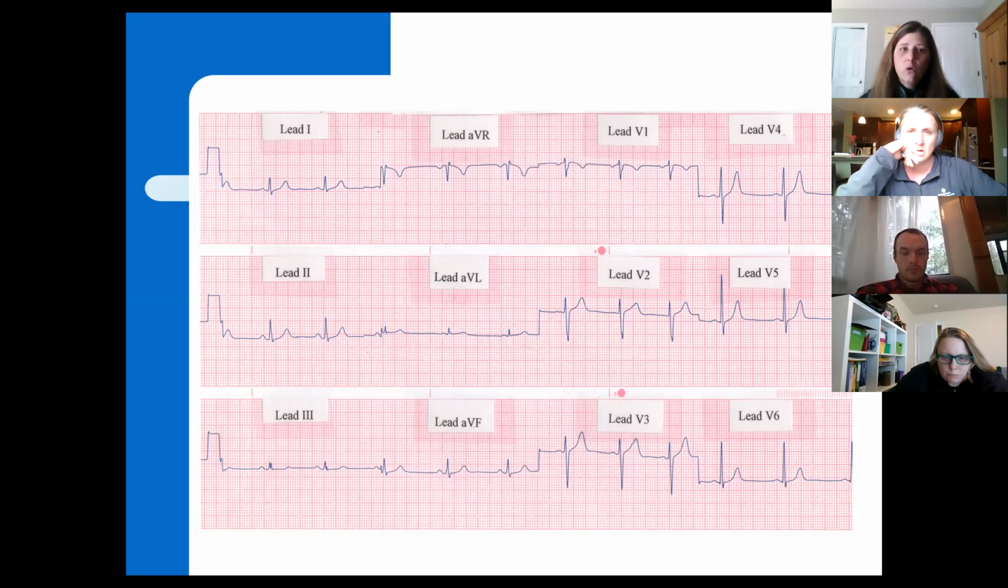Now, what's not shown here on this picture is typically at the very bottom below those 3 rows, there is a 4th row. And that 4th row on that 12-lead EKG will be a full EKG strip, a 6-second strip at least. And it will give you a really good look at what the rate is, because from all these other little snippets, you just have a small little 1.5, 2 inches wide.